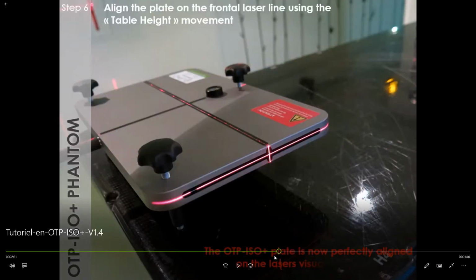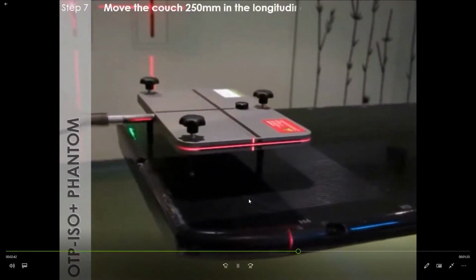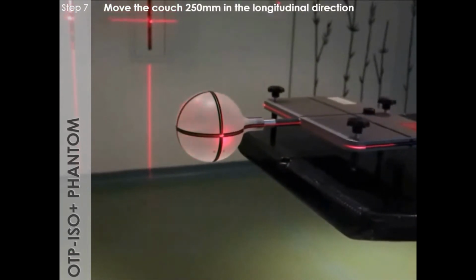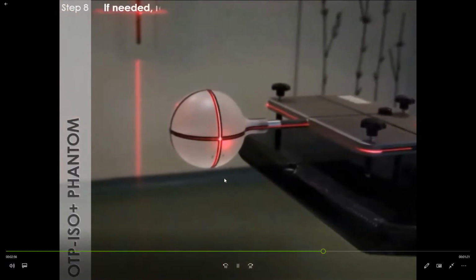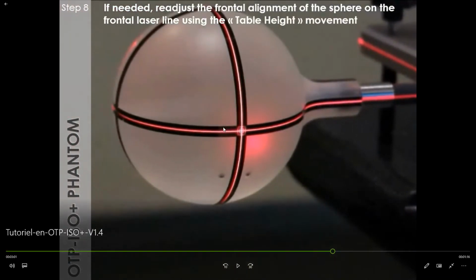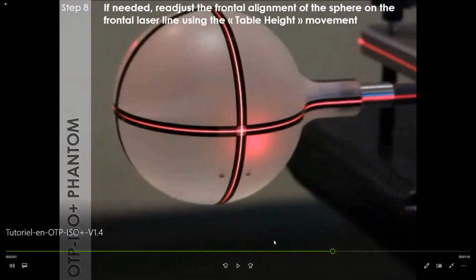The next step will be to align the sphere. You will move the couch 25 centimeters towards the feet to line up with the sphere. Given that the couch is empty, there is a slight tilt. You will see that the technician will use the couch height movement to compensate for the tilt and return onto the white engraving. Here you will notice just how efficient the white engravings are in order to distinctly see the lasers, eliminating the need for a sheet of paper.